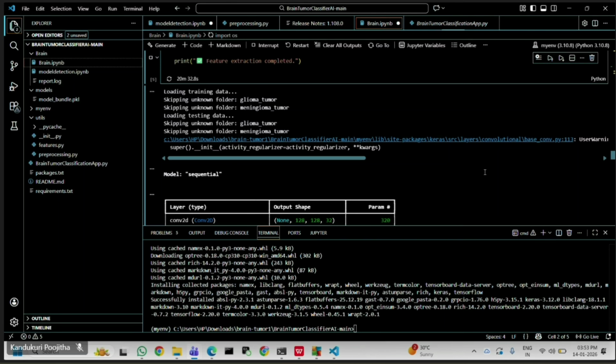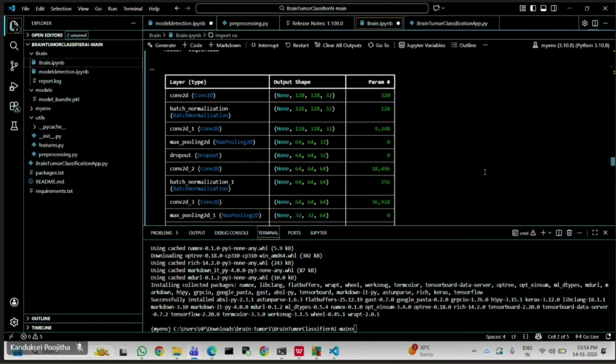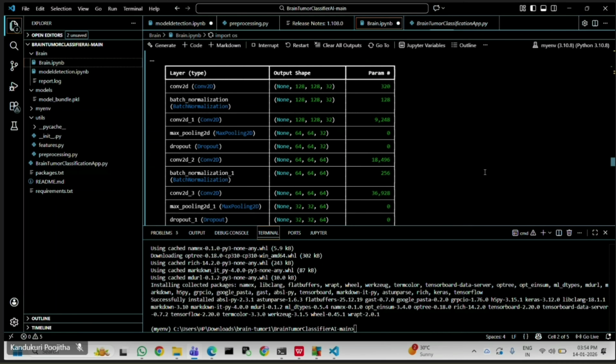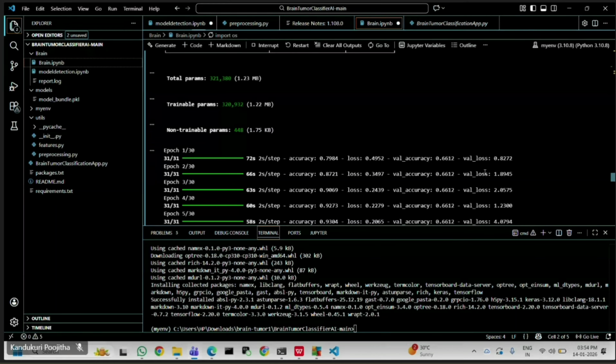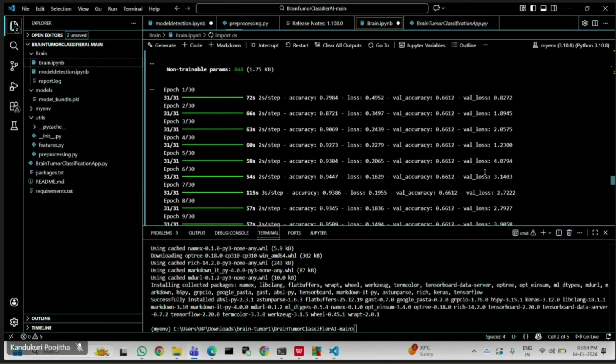The main motto of GLCM is that raw images are very large and too complex for direct classification. In that situation, GLCM helps convert images into numerical features, nothing but image features. The main usage of GLCM is that it captures texture information in the form of contrast, homogeneity, energy, and correlation, for which we have mathematical formulas also.